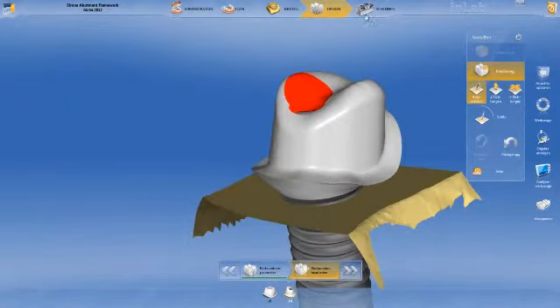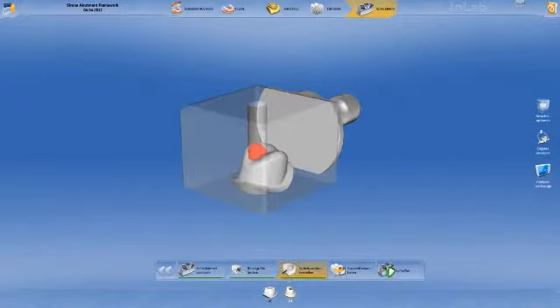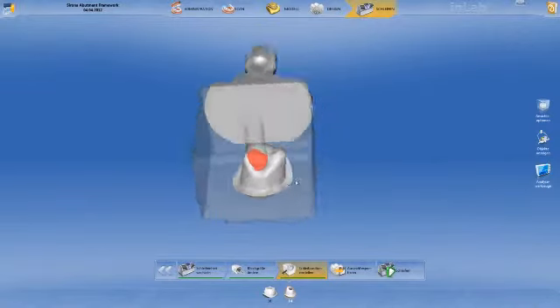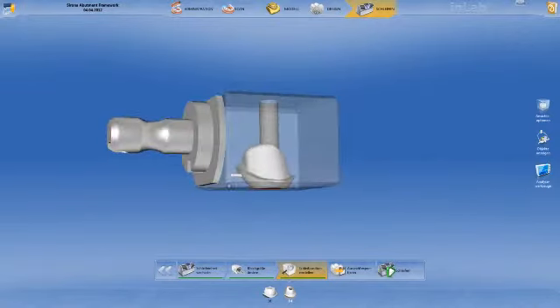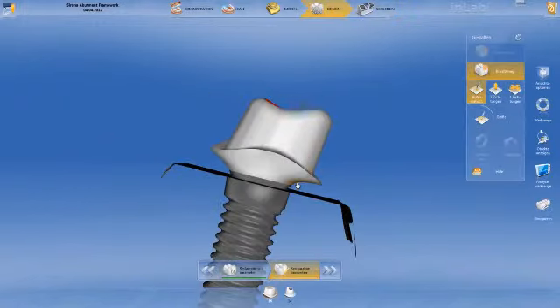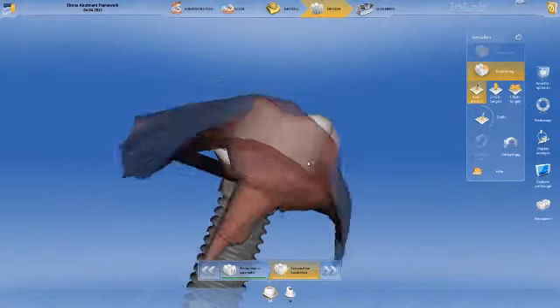If I am satisfied with the anatomy, I click on Mill and am taken to the milling preview with the pre-cut hole for the screw and the sprue location. The same is done for 16. Change the size of the instrument and build up the pressure on the gingiva.